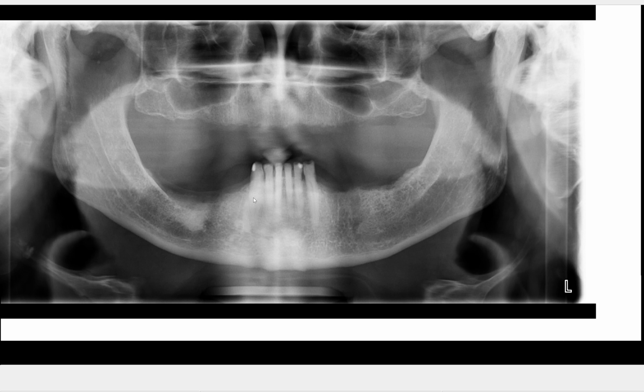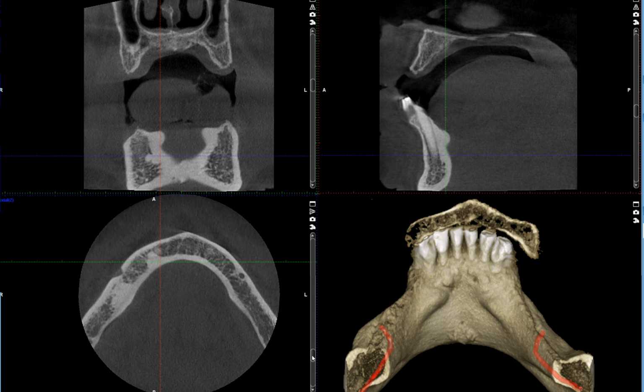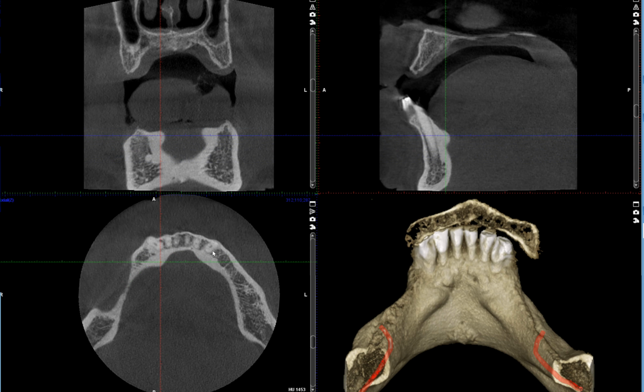If you haven't been able to answer it by now, I'm going to show you the CBCT scan, which should be very clear to all of us. So this is the CBCT scan of the patient, and let's take a look along the axial view. Again, we can recognize these two canines, and if you remember, the opacities were located along the area of the canine.